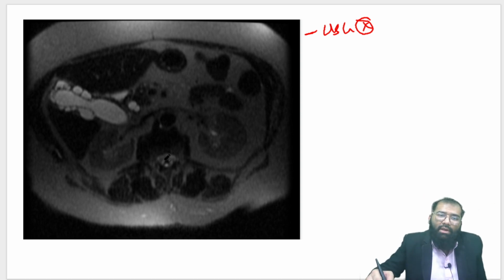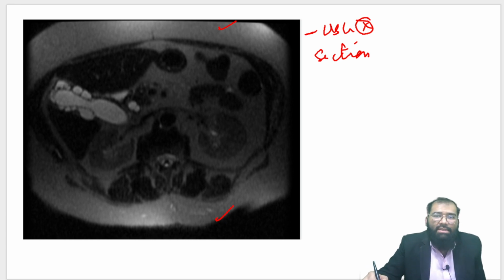Next, you are able to see the anterior aspect as well as posterior aspect very clearly. It's a sectional imaging. It's a section. So this is either CT versus MR. So are you able to see the bones which are dark?